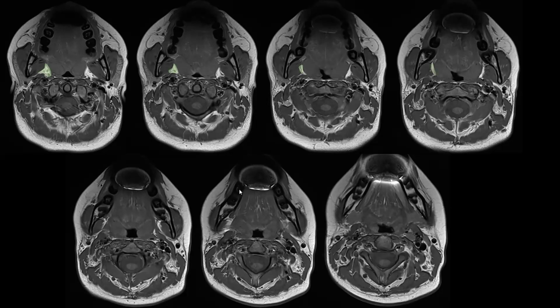We are now at the level of the palatine tonsils. It has become very small, smaller still, and then we end up above the submandibular glands. So the parapharyngeal space extends all the way down in the suprahyoid neck to the level immediately above the submandibular gland, and basically there's an anatomical continuity between the submandibular space and the parapharyngeal space. And if you look at these images, you can now understand why.